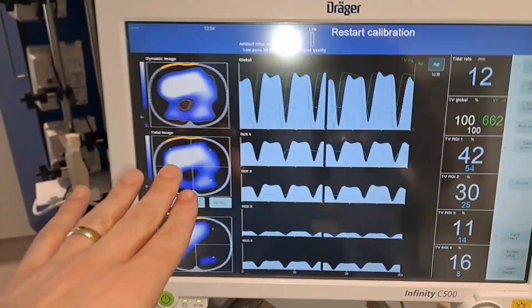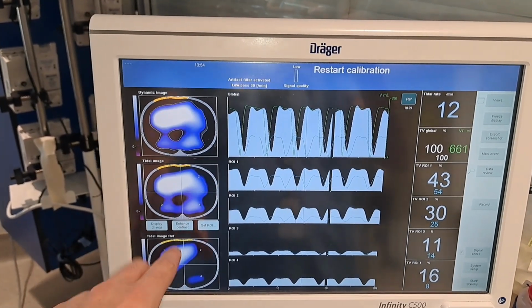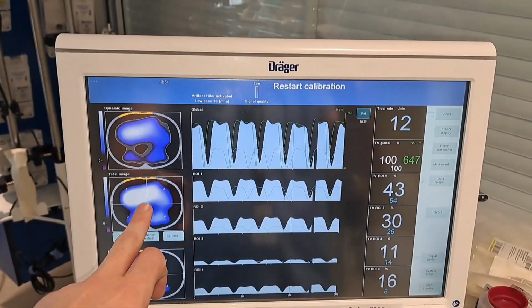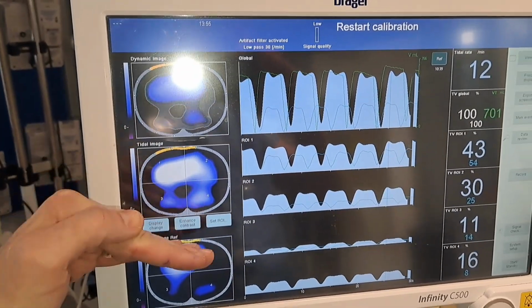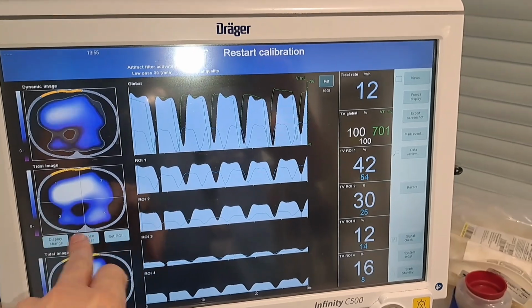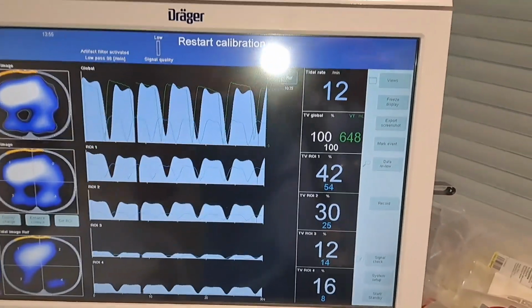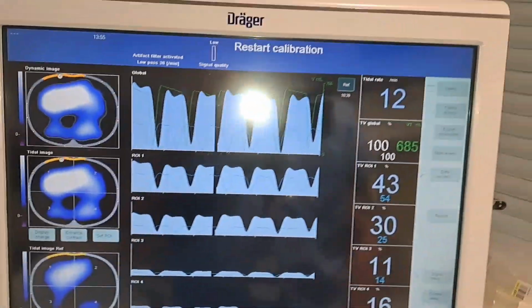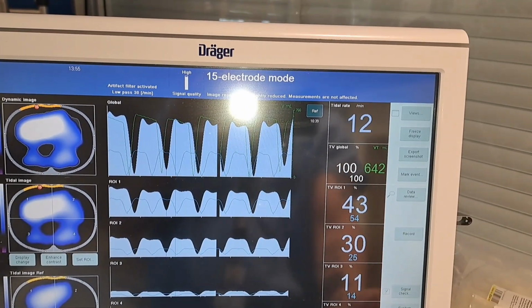16. Ideally, when we're looking at quadrants, we want the lung to be the most homogeneous. So we're expecting 25% of the tidal volume to be distributed in each quadrant, right? It's different when we do ventral, mid-dorsal, and dorsal. Those are different percentages. Usually it's 8 to 15 on ventral and dorsal, 35 to 40 in the middle section. But for this one, it was really quadrants that we're looking at. So like I said, we want to get as close as possible to 25 everywhere.